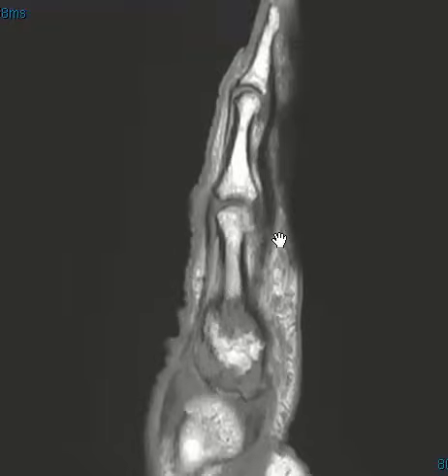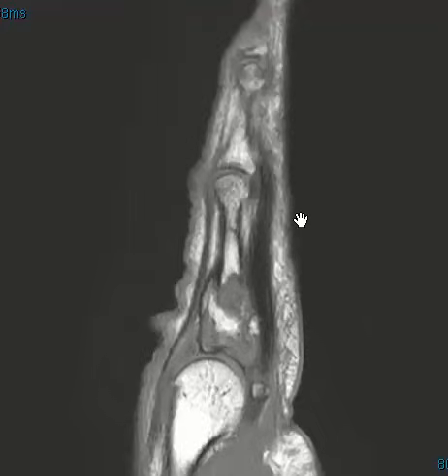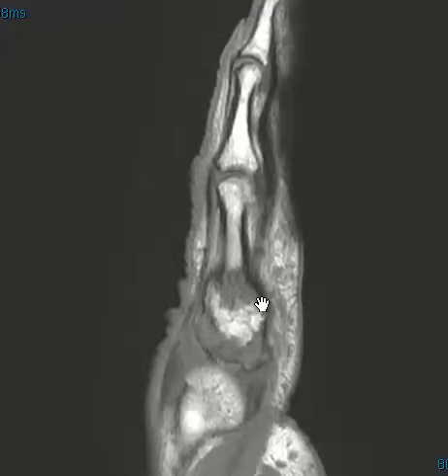And when you see one of these in a finger, especially the proximal phalanx, think about an enchondroma. They're very common here, and again, most common in the proximal phalanges, then the middle, and then the distal phalanges. And unlike elsewhere, like in the knee or other places where you have the speckled, mottled calcification centrally, this doesn't have the calcification, and so on x-rays it just looks like a lytic bone lesion like we see here. So classic finding of an enchondroma in this patient.